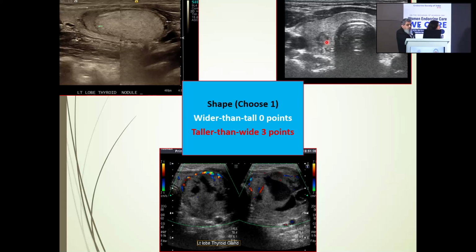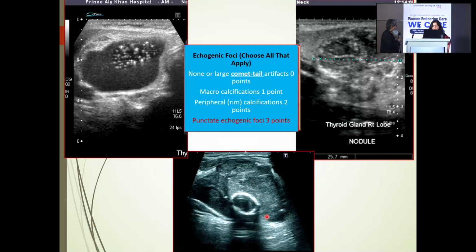Thyroid imaging does not allow us to use too much vascularity as an interpretation criterion, but it allows us to use it to say a particular nodule is solid because vascularity is inside. So we use that for that criterion. And there is one more thing: sometimes nodules are in between, and then it becomes a little complex whether it is wider than tall or taller than wide, and then we apply other criteria. Absolutely, that's very important that we understand that.